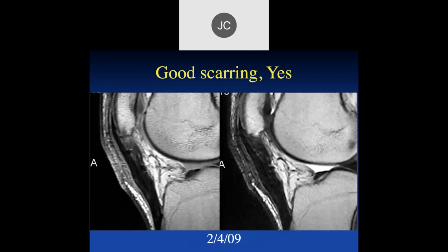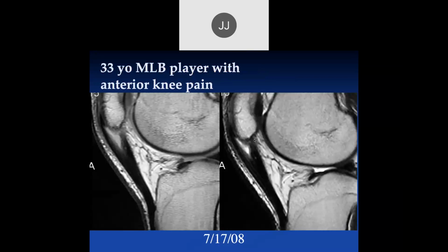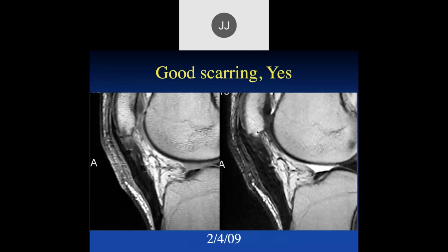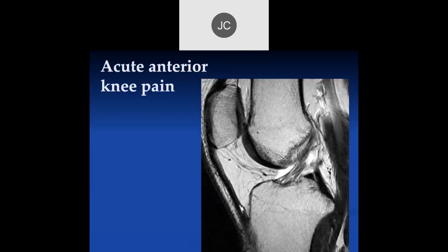It looks to me, John, like the distal pole has been transversely cut. And you can see that it's kind of rounded, and then reattached to the patellar tendon. You can see the metal artifact here. So they kind of implanted the tendon into the posterior aspect of the patella, because otherwise it doesn't work any other way. Yeah. Robert.